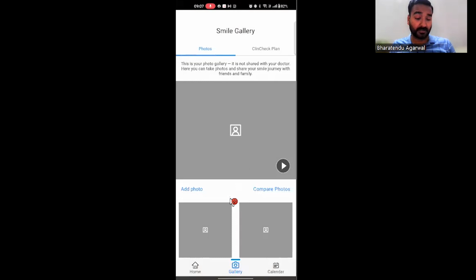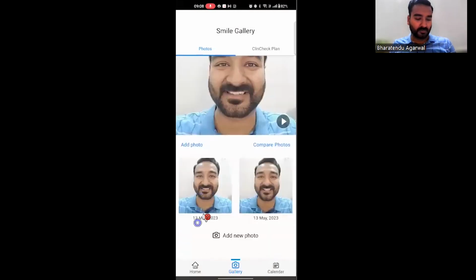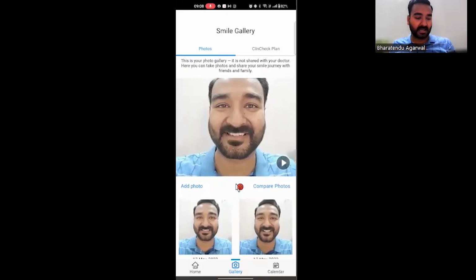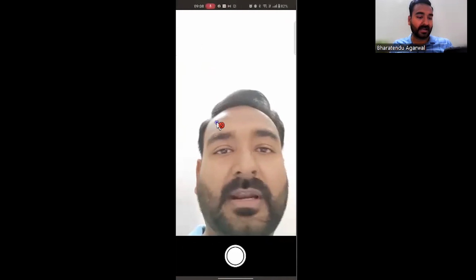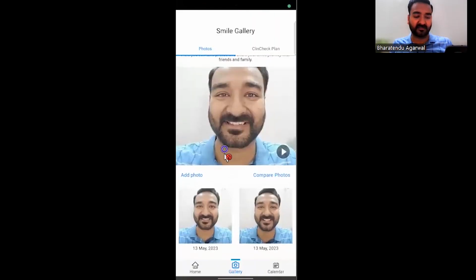Okay. All right, so it has an interesting section here. So it has two pictures. One is the first one which we just uploaded initially, and the second is the one which we took just now. So right now it's saying add photo. Add photo would mean that you are adding an additional picture. We don't want to do that today because we can't really spot the difference. And then it's saying compare pictures, compare photos. Let's click on compare.